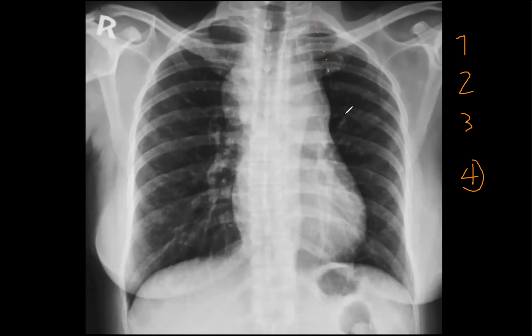Let's go from down up. Continuity with the left cardiac border: inseparable, silhouetting of the left cardiac border. This is number one. It means it's an anterior structure. I can see the descending thoracic aorta through the lesion, and the descending thoracic aorta is a posterior structure. Again, it suggests this soft tissue mass is anterior mediastinal. Its upper border is fading out at the clavicle on both sides, which means silhouetted above the clavicle, a positive cervicothoracic sign.